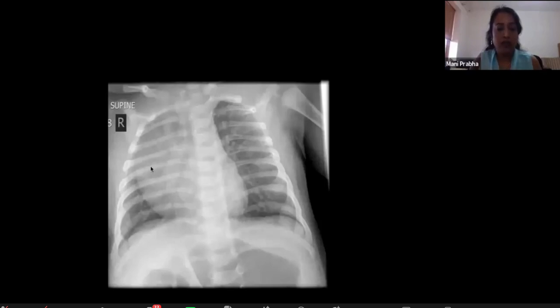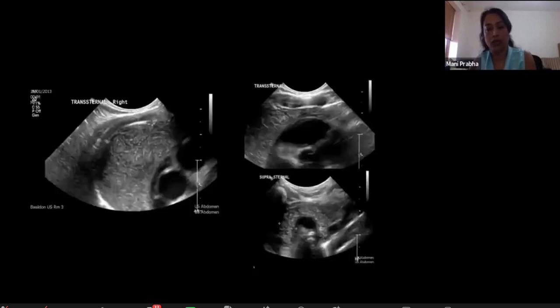And then there is lucency also, which is again very important. There is no expansion of the thorax at all. So these are the points which you should consider: density of the lesion, outline, and homogeneity. Density, homogeneity, and outline. And then if you are still confused, you can ask for an ultrasound scan. These are real life scenarios when we find it difficult to say that it is definitely thymus, and then we move on to ultrasound.